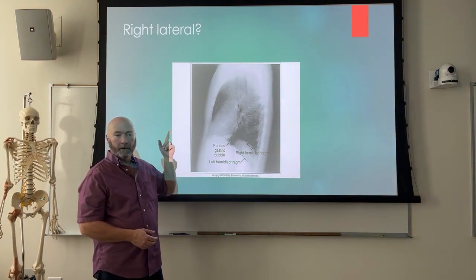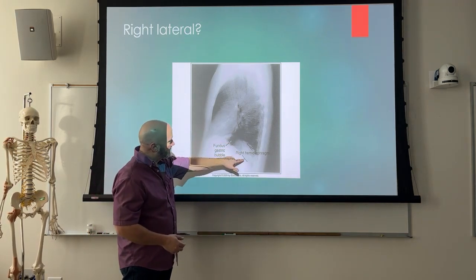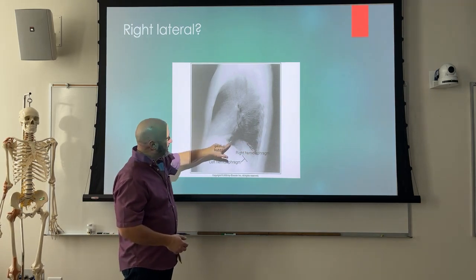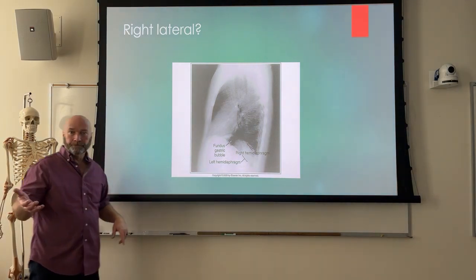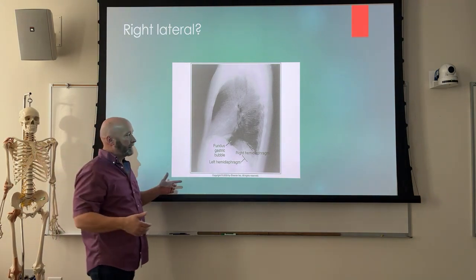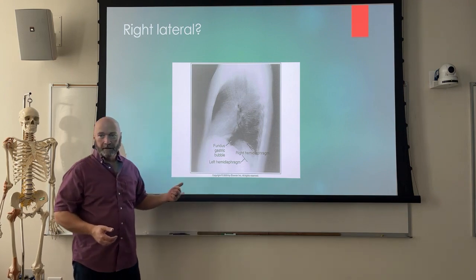It's up, right? So if this is a left diaphragm here, following this on up, if that's a left diaphragm and that's a right diaphragm, that would mean that the gastric bubble is either above the diaphragm or the patient's anatomy has a stomach on the wrong side, right?